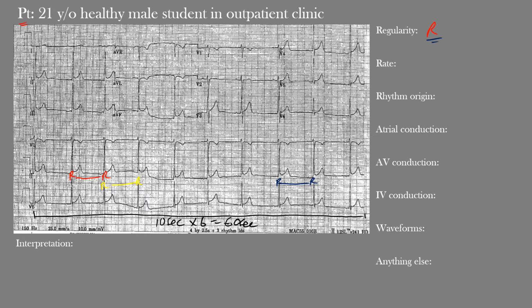Okay, so I'll give you the actual rate here was 57 beats per minute. Okay, so if we count these now going across we see 1, 2, 3, 4, 5, 6, 7, 8, 9, 10. Okay, so we would do 10 multiplied by 6, okay, and that gives us 60 beats per minute. So pretty close approximation, okay, to that 57.